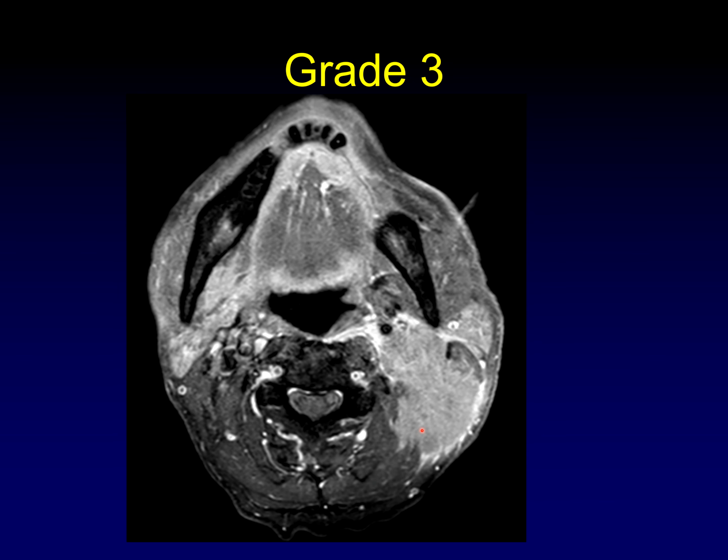So here's a situation where you might be wondering, I'm not sure if this lymph node is invading that internal carotid artery there. It's only touching it on a small surface, and we'll come back to that. But it doesn't matter because there's such obvious invasion of the paraspinal musculature here with definite fingers of tissue extending into that musculature and extensive destruction of the sternocleidomastoid muscle. There's only a little bit of it remaining. Most of it's been eaten away by the tumor. So here's definitive muscular grade 3 iENE, regardless of how certain you are of the artery.